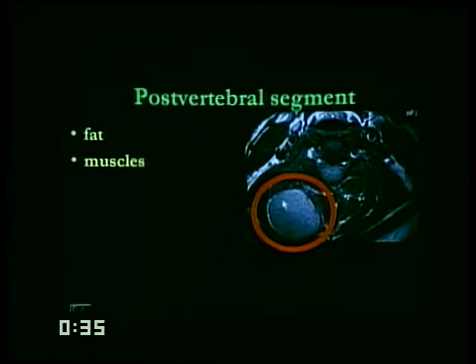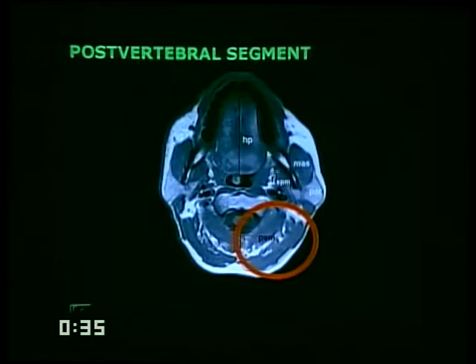With fat-suppressed sequences, you see chemical shift artifact, and you know that you can get a well-circumscribed fatty deposit in this location, which is a lipoma. Often focal fatty deposits over here may be ill-circumscribed but clinically palpable, and these are just focal fatty depositions. They're not technically a lipoma, and so they cannot really be excised.